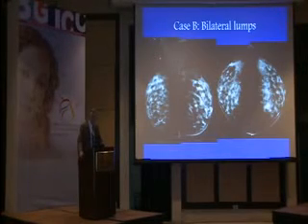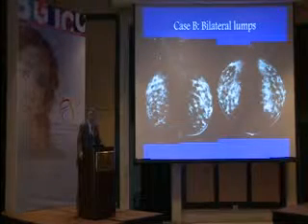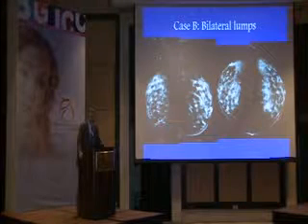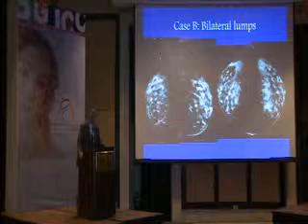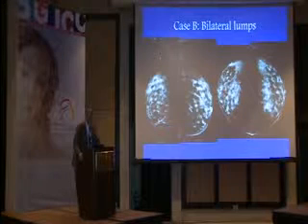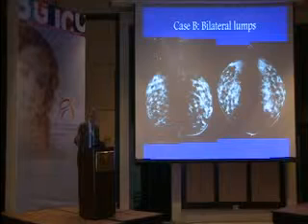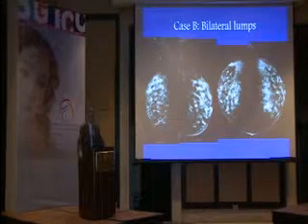So before I go into the second case, what we learn from here is that look at the indirect signs, especially when you have dense breast. This is, of course, the nightmare of every radiologist practicing screening. But just with MAG, do magnification, look for the subtle indirect signs of architectural distortion.